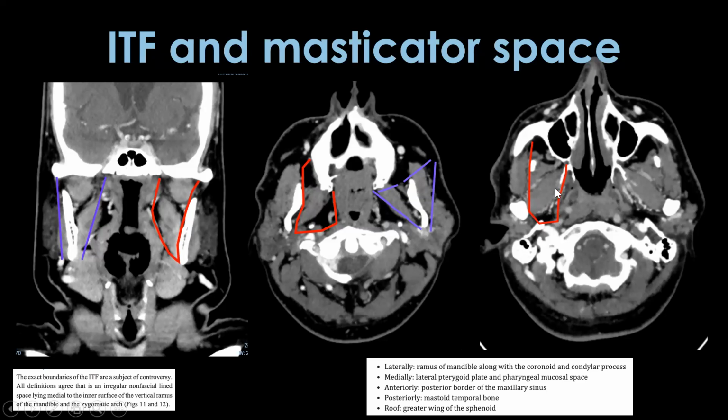Another thing that we have to know here is, so this is the lateral pterygoid. Even in high ITF, there is a slight distinction when there are lesions which are more anterior, like involving the retroantral fat. Even if they are high ITF, they can still be amenable to surgery. When they start involving the pterygopalatine fossa or the pterygomaxillary fissure, then they are considered high ITF and they have worse prognosis.